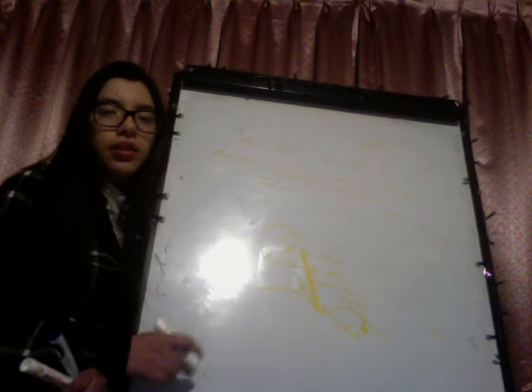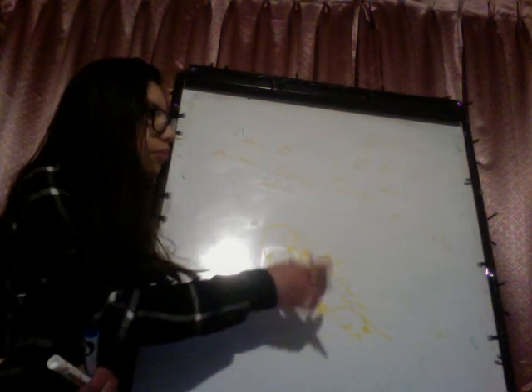After the gastric bubble, we have the effusion that we will see later, and the fracture we also will see later. So now the diaphragm and the gastric bubble. I forgot here the diaphragm and the gastric bubble.